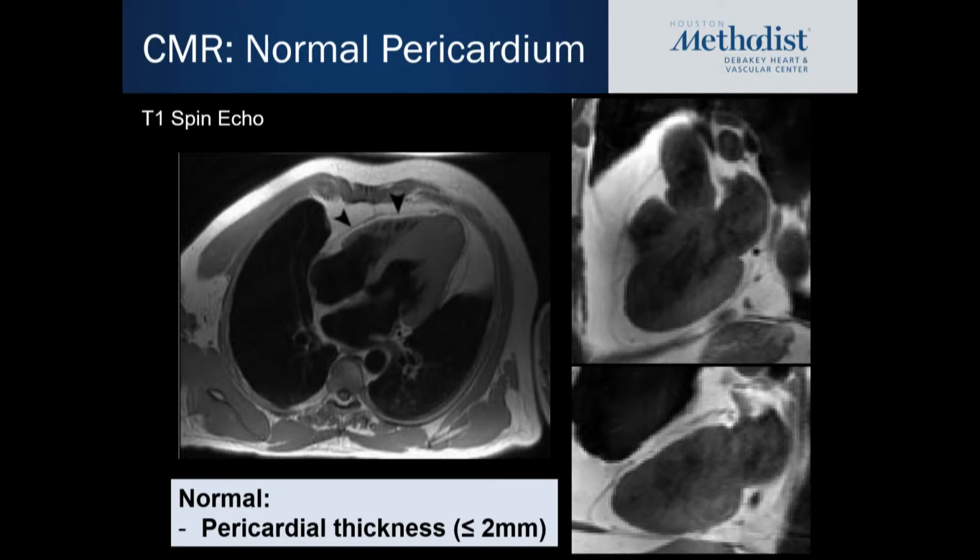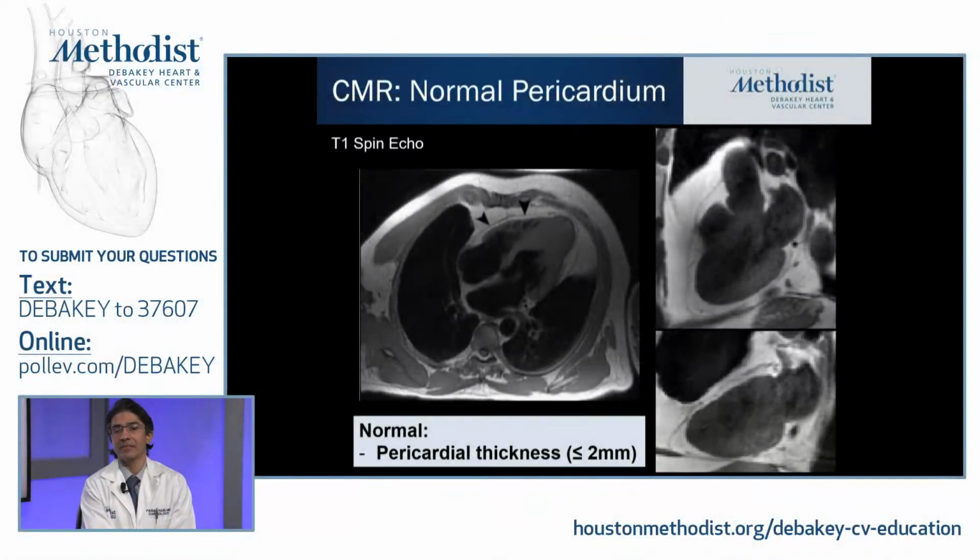Another thing to note here is that the pericardium generally is very well seen anteriorly, over the anterior portion of the heart, because that tends to be where all the fat is, as we saw in some of those pathological images by Dr. Malahfji. Whereas on the posterolateral portion of the heart, there's less fat, so it's less evident there because you don't have the surrounding fat to bring it into the picture.